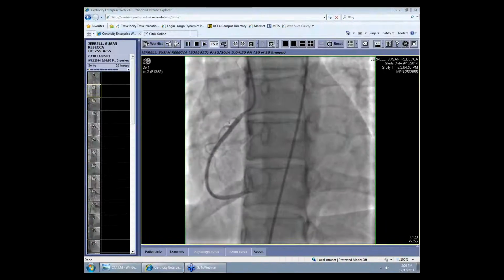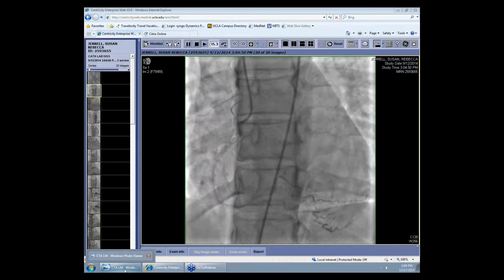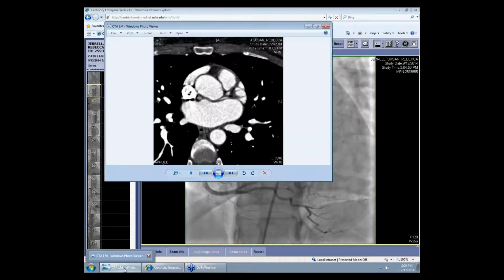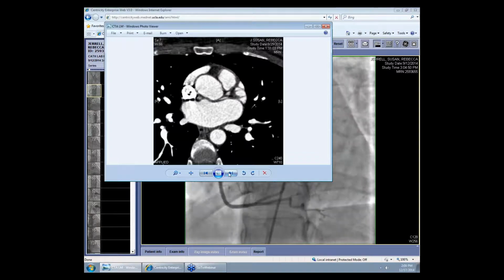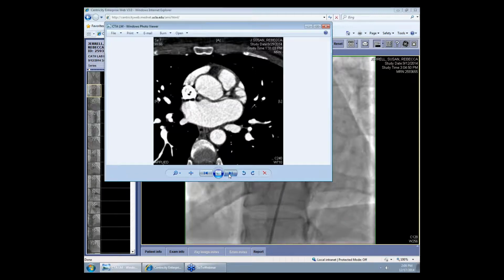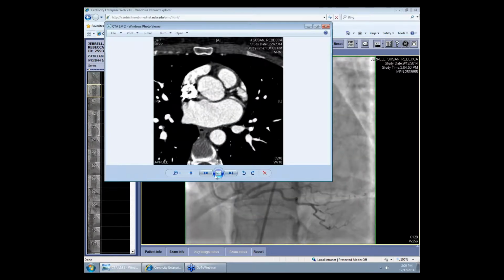For a coronary CTA, which showed that she had anomalous origin of the left main. Do you want to show that here? So we'll show you the coronary CTA. And here you can see the origin of the RCA in the left system. In the next image, you can see it further subdivided, the left and the RCA.